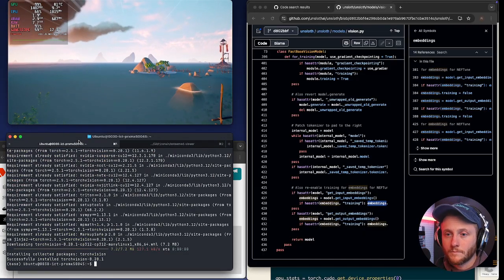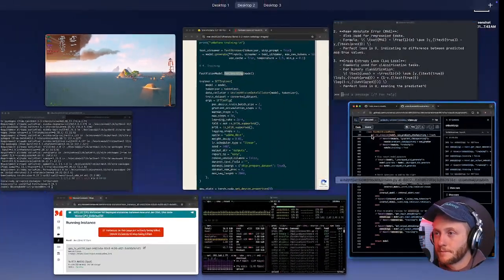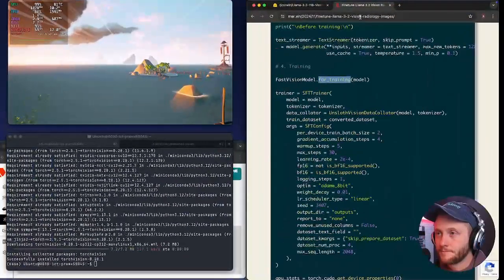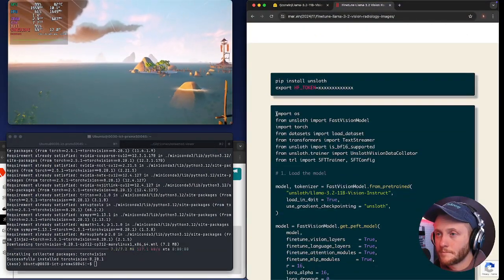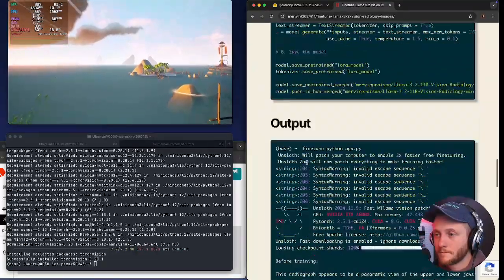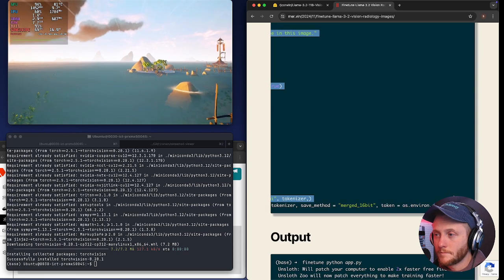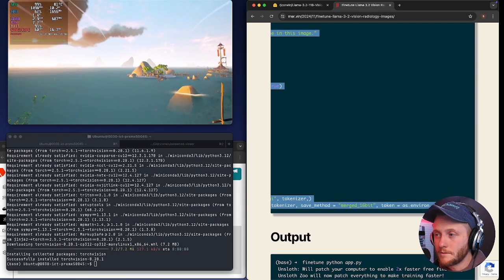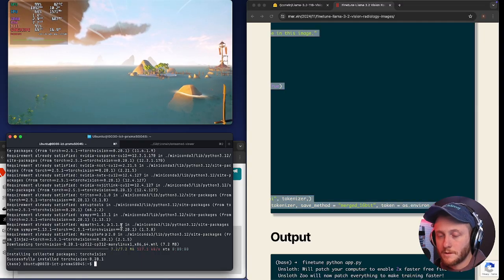All right, we are installed. Let's get our code. And RJ, don't let me forget to get a write token.